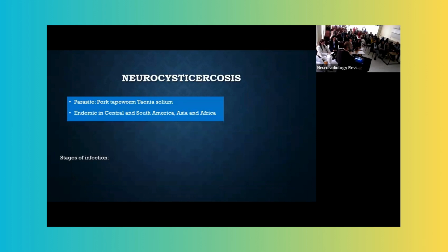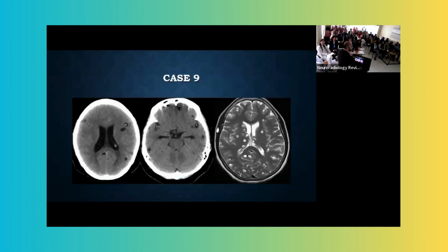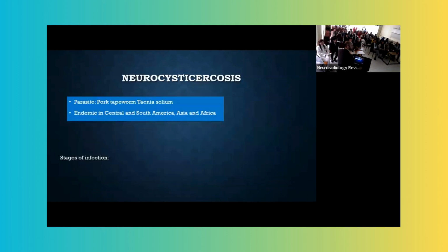So luckily we don't have that, but typical features: target sign, it can be intraparenchymal, extraparenchymal, it can look like an arachnoid cyst, but you have to look for the dot sign, and you can also see on the MR scan a T2 low signal dot, okay? Right, so we've got 2 minutes, so we'll go through. I'm sure we'll get through.